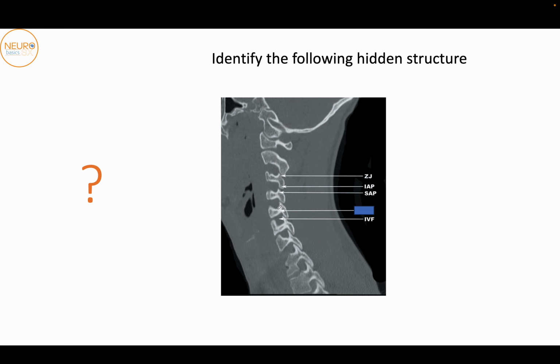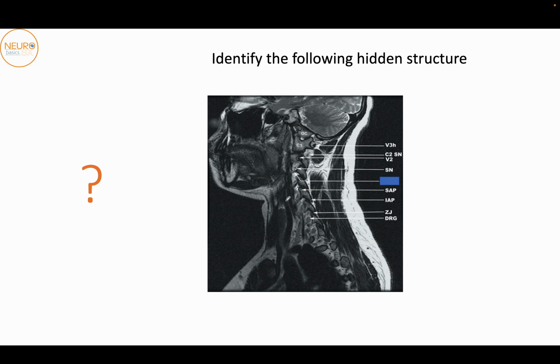Okay, so this is the pedicle over here. This is the pars, but where the arrow is pointing is the pedicle. Okay, can we identify what is this structure?